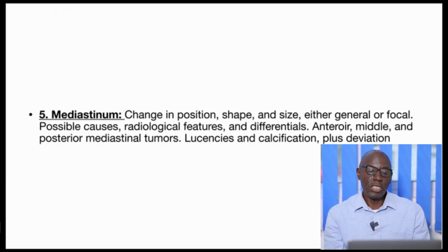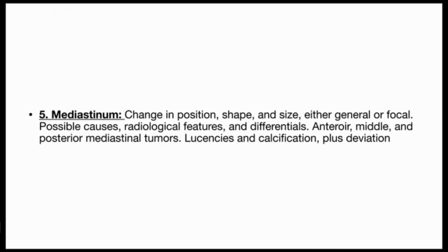Now, the change in position, shape, size are some of the aspects we look at when we are looking at the mediastinum, and the possible causes like the chest wall, diaphragm, and the anterior mediastinum, they come quite handy. Yes, I think let's start from there. And we discuss the mediastinum in detail.